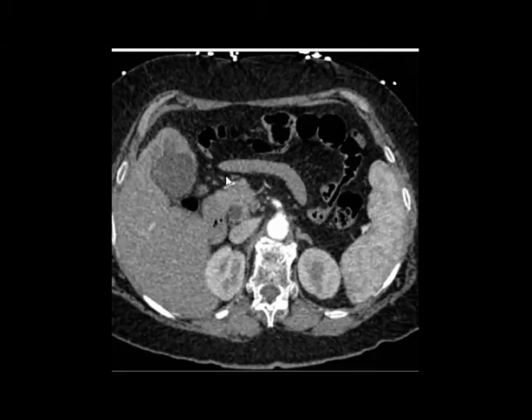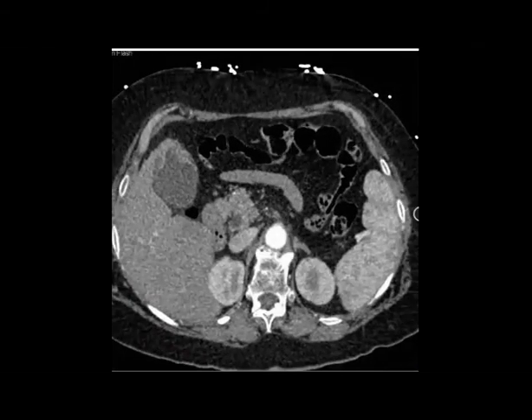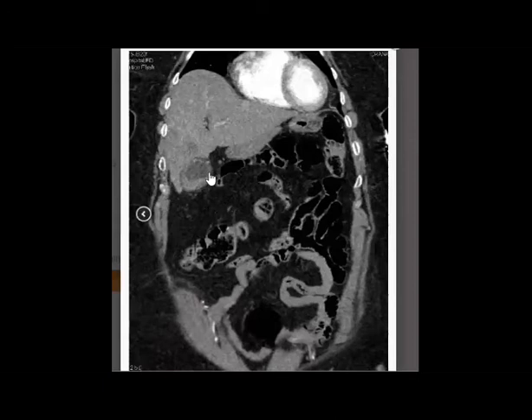So describe better first. For example, here you will describe that there is maybe a soft tissue nodular lesion, and it takes not just one nodule, it is multiple, and they are confluent together. You can consider it a thickening, yes. Then go to the interpretation and start to think about anything else.